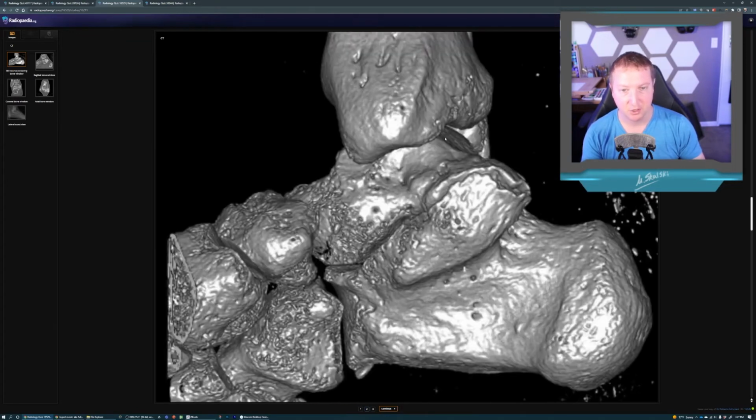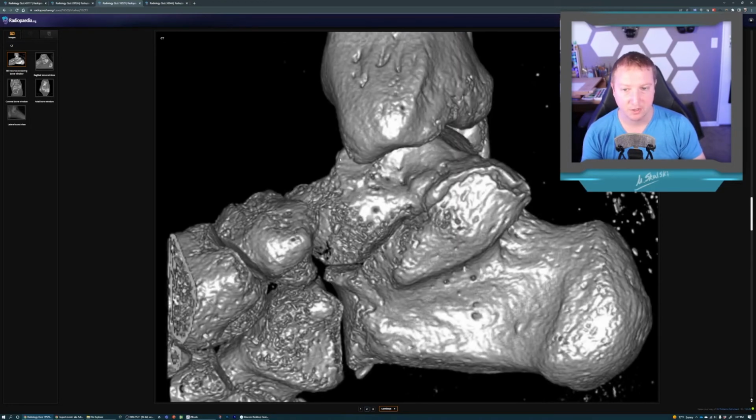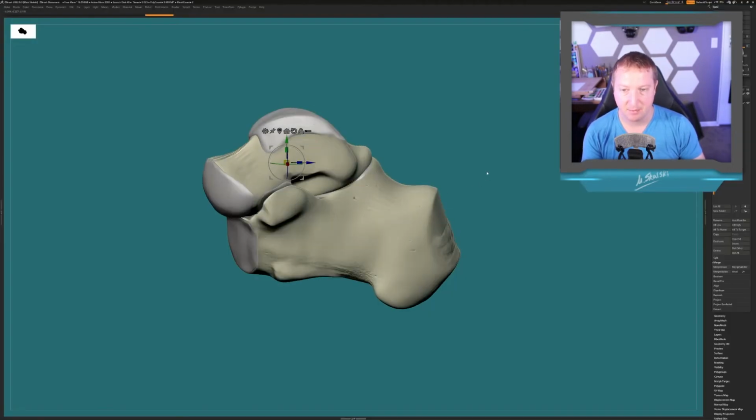And so you can see why this would cause that continuous C sign, which is what we usually look for to detect this on radiographs, where the top of the C is the normal talar dome, and then usually there should be a little gap here. So if I switch back to my anatomic model, right, you're going to see the top of the C, and then it's going to be broken, and you'll have this kind of gap of radiolucency before we get to the cortex for the sustentaculum tali. And so the continuous C sign, when that is extending around, is just showing you that continuity here.